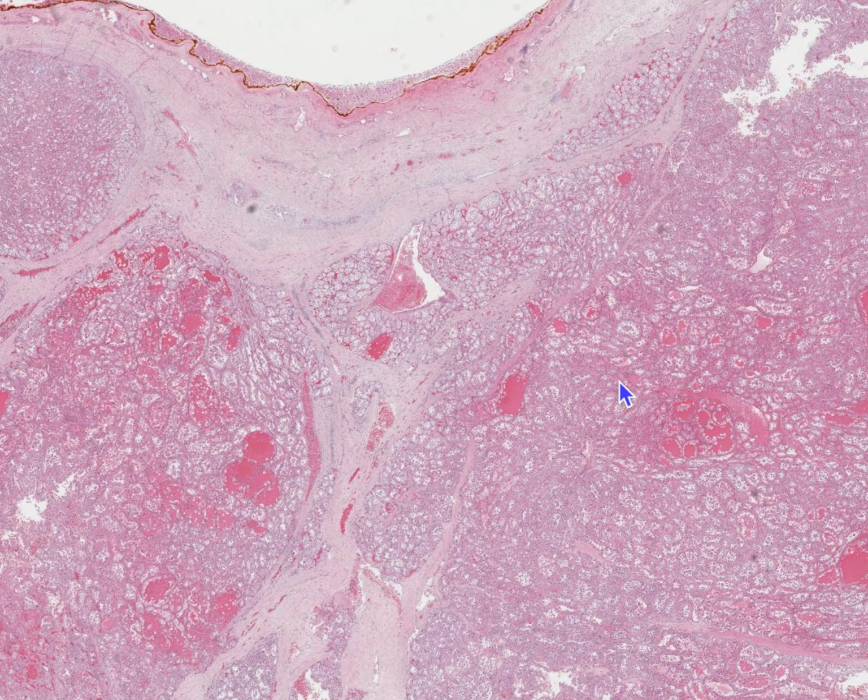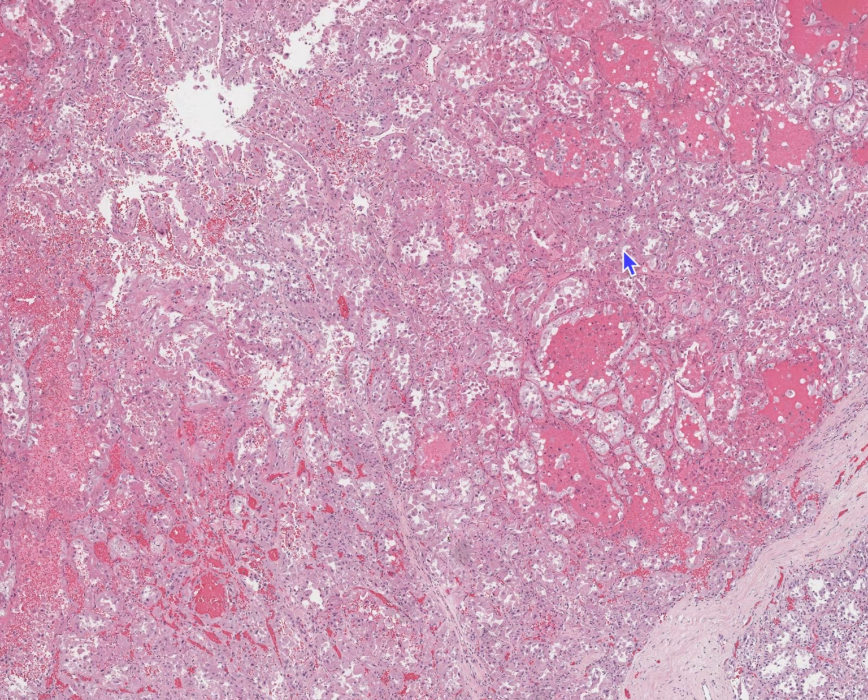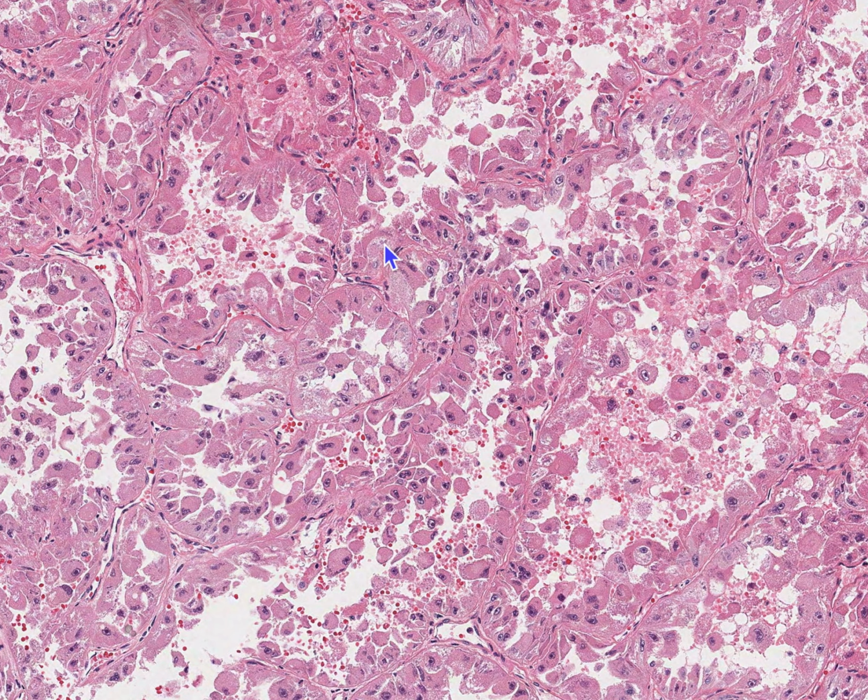So if you're not sure based on the architecture and the cytology, you can do a TFE3 stain, because again, this translocation is X17, ASPSCR1-TFE3. TFE3 will stain nuclear, and you can also do a PAS, and it'll stain that eosinophilic cytoplasm. Your differentials are metastatic renal cell carcinoma and melanoma.